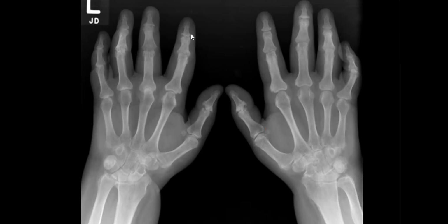So proximal and distal, you see this sign, it's called the gull-wing sign, and it is seen in cases of psoriasis. Sorry, what is the name of the sign? This is the gull-wing sign. No, not seagull. Mouse ears. It's a new bone formation at the edges. By the way, this is a case of distal erosive arthropathy.